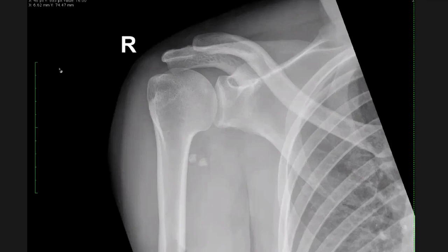You mean soft tissue swelling? Yes, a halo around. So you think this is not in the joint, this is in the muscle? This is in the muscular compartment. The adjacent bone cortex is intact.